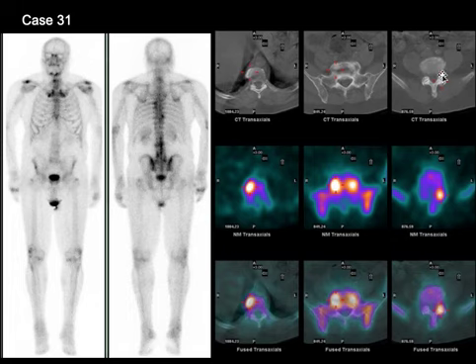And also another focus more posteriorly located, seen here, and this is a facet joint. So increased uptake in a joint always is secondary to arthritis and unlikely to be from metastatic disease. So with SPECT CT, if you can localize the foci of increased uptake to degenerative disease, osteophytes, facet joint arthritis, then you will be able to rule out metastatic disease.